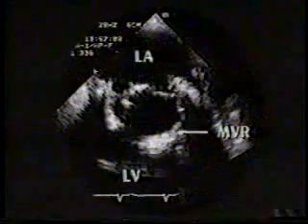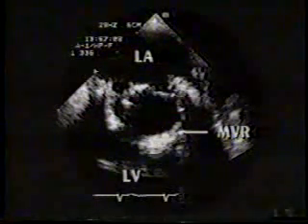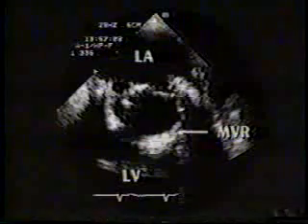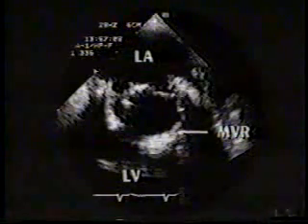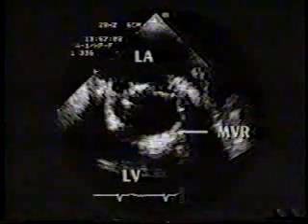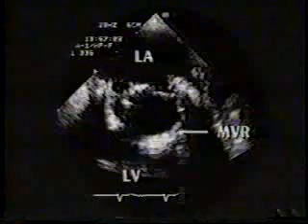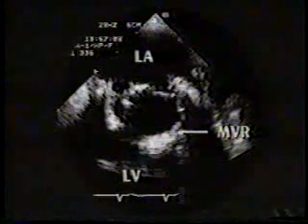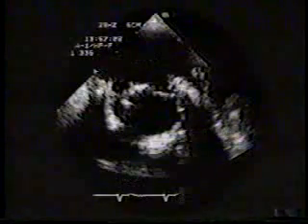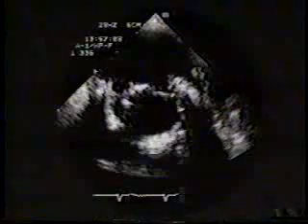The last two studies have shown how transesophageal echocardiography can delineate prosthetic mitral regurgitation, whose presence or severity is not expected from the surface color flow exam. Because of its importance in diagnosing prosthetic mitral regurgitation, we would like to illustrate the use of TEE for two additional cases. This is a transesophageal study from another patient with a mitral heterograft prosthesis.